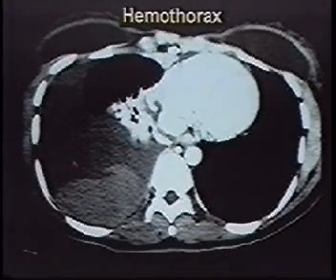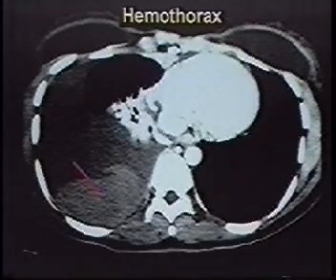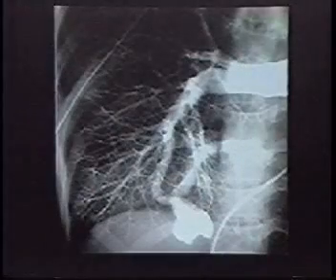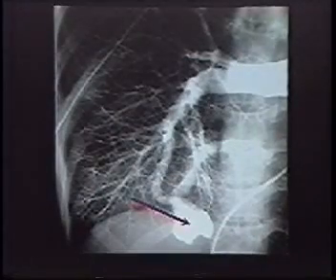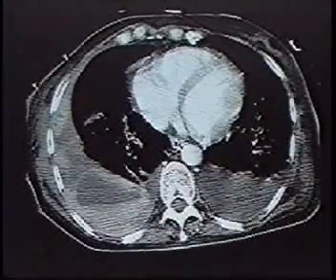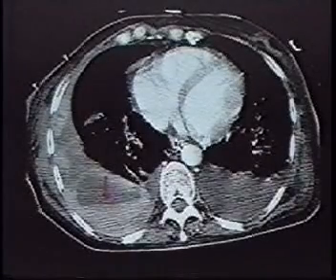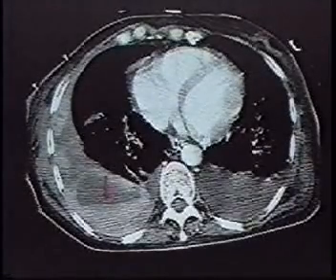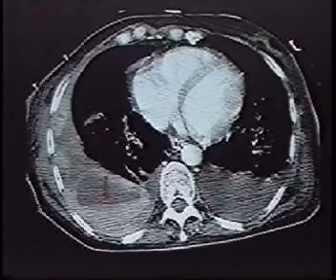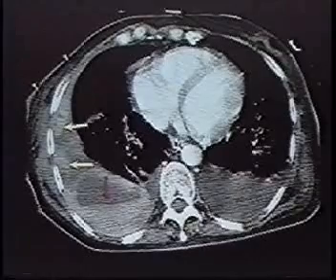Here's an example of a hemothorax with a radiodense clot layering dependently in the right hemithorax with extensive associated fluid of lower attenuation. And this is a patient who had a ruptured pulmonary arteriovenous malformation. Another patient with a hemothorax shows a fluid or hematocrit level with a more radiodense component layering dependently. And this is a patient who had pleural hemorrhage secondary to metastatic disease to the pleura.